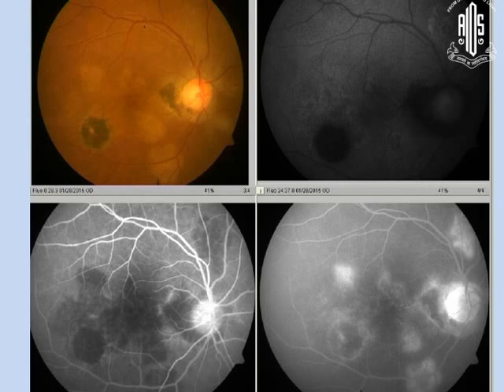It remains a black scar there and it remains like that. Only the edge is staining. But this lesion where we are suspecting activity, it is hypo and in the later phase it becomes hyper. So that shows that clearly it is an active lesion there.